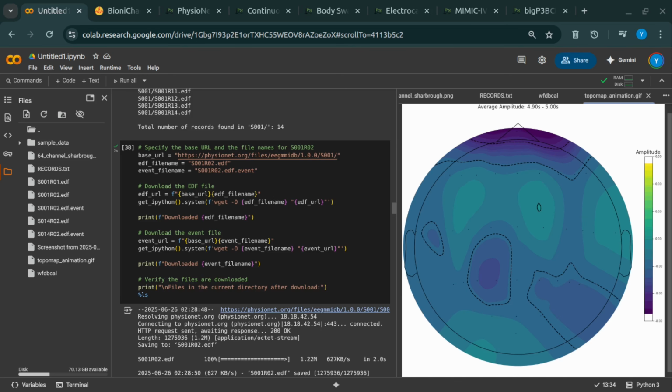So to analyze how the brain responds to things, you don't usually look at the whole continuous recording at once. You epoch it. Epoching. Explain that again. It's like taking scissors to that long stream of data. You cut out small, precise windows of brain activity centered around each event marker. So if T0 is our event, we cut out a little chunk of data right around time T0. Okay, like taking snapshots around key moments. Yeah, it makes analysis easier. Exactly. You could average these epochs, compare them.